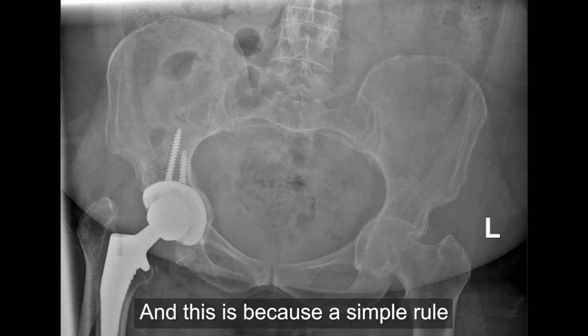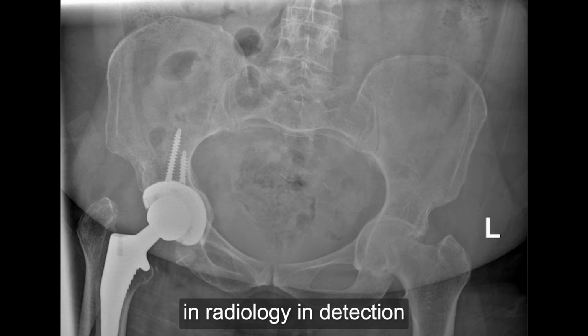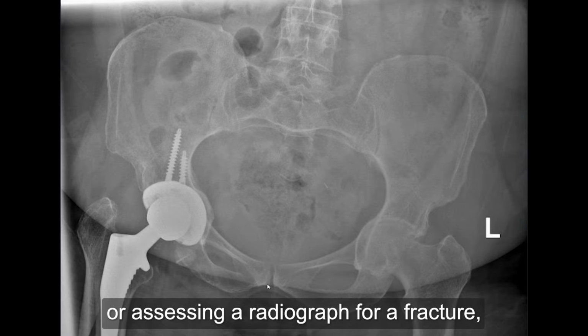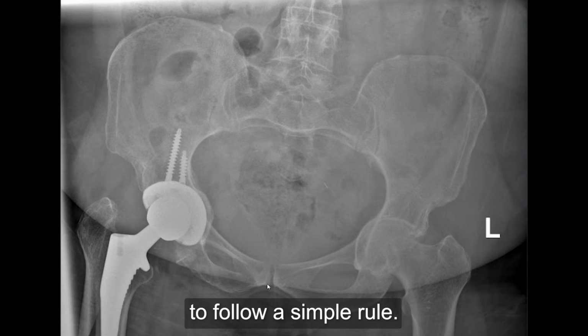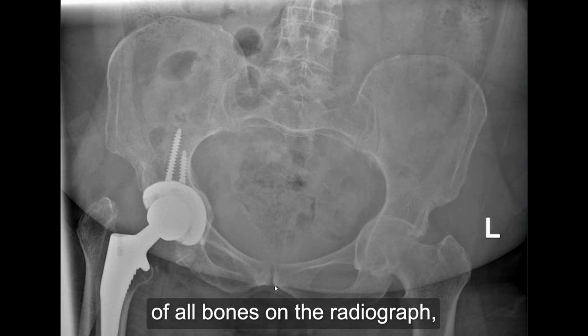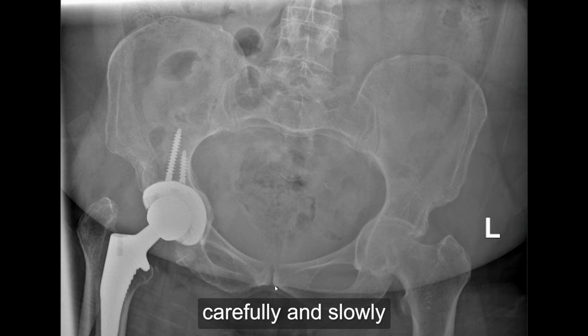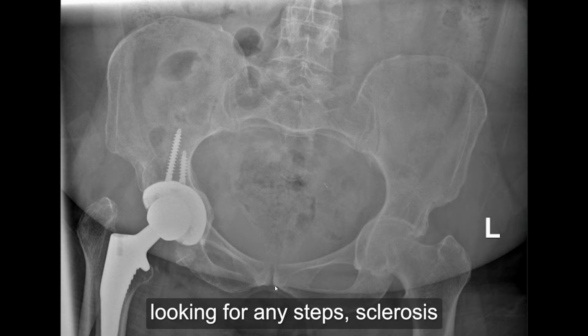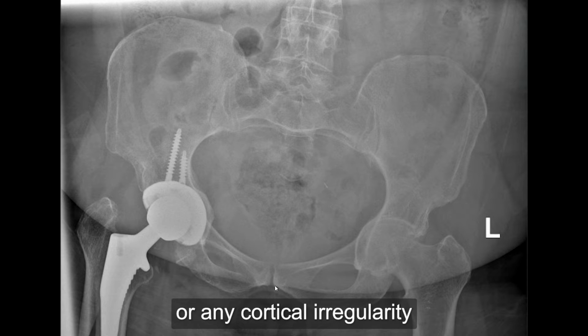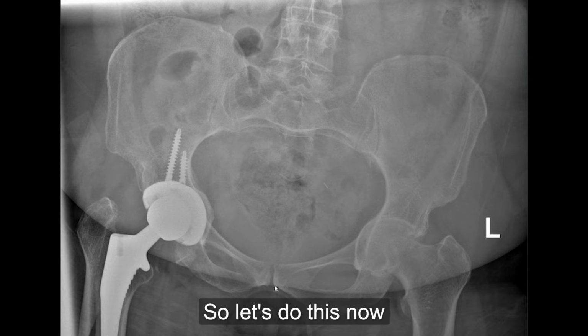And this is because a simple rule in radiology in detecting fracture was not applied. It's a simple rule which advises doctors or whoever is reporting or assessing a radiograph for a fracture to follow the cortices of all bones on the radiograph carefully and slowly, looking for any steps, sclerosis, or any lucent line, or any cortical irregularity. So let's do this now and see whether you're going to find the fracture or not.